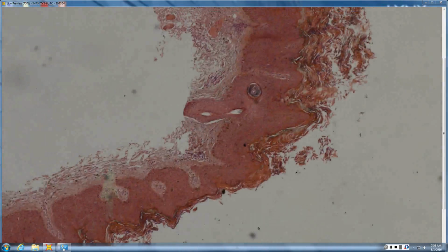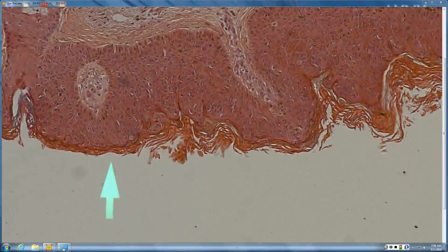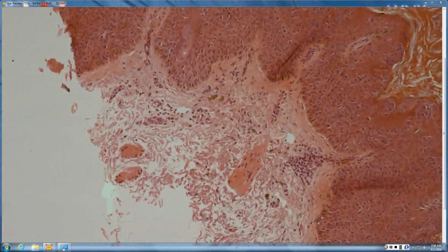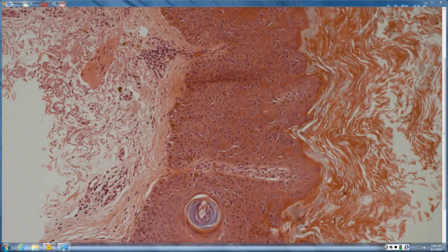So I got a shave biopsy. Looks like there's some sort of proliferation within the epidermis. You see some large atypical looking cells. Definitely disorganized basal layer. Looks like it seems full thickness to me. Yeah, and in areas it's kind of clonal. There are individual little clones sitting in the epidermis, which is something that an AK is not capable of doing. So when you see little clones like that, that leads you more towards Bowen's.